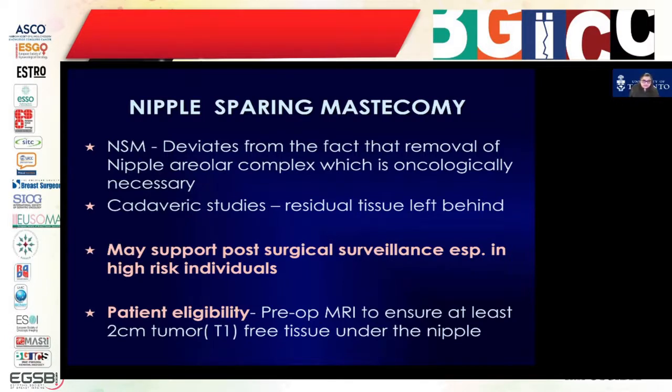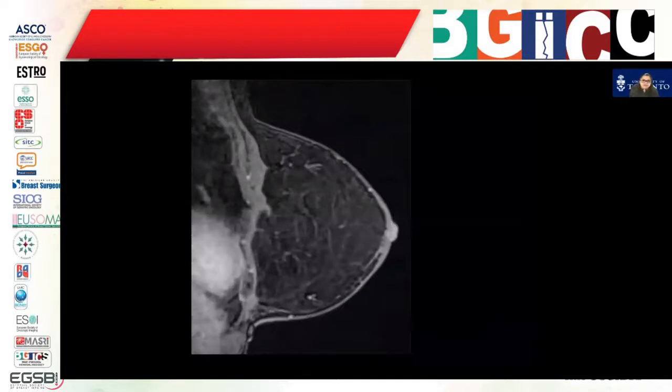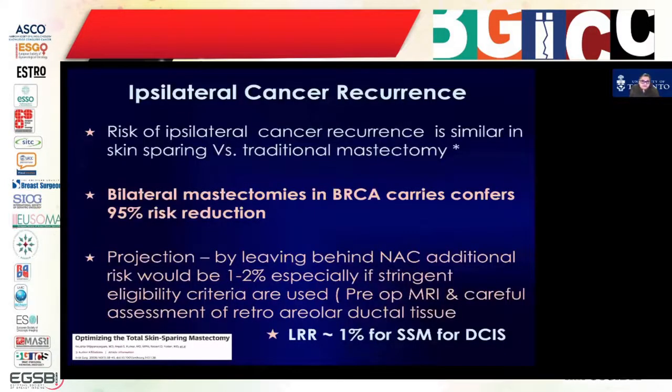So it's important. We have seen some women who, after their mastectomies, start developing axillary breast tissue or breast tissue somewhere in the subcutaneous regions, and it's pretty astounding how the breast tissue starts to grow after removing the entire tissue. So these women actually need some kind of surveillance, but there's not enough data. This is a nice nipple sparing mastectomy, a sagittal view. And so that was about nipple sparing mastectomies and skin sparing mastectomies.